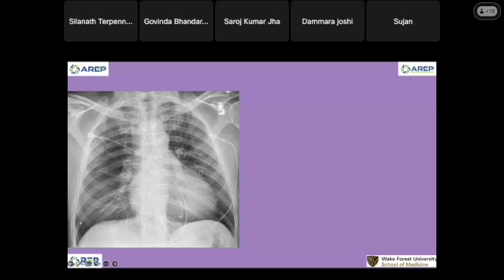Okay, that's for now. If we see this study on your end here, I'm gonna say cardiomegaly. When I say cardiomegaly, I say enlarged cardiac shadow or cardiac silhouette. I don't say cardiomegaly because for me, the words enlarged cardiac silhouette can be one, really, really big dilated chambers, or two, something else like an effusion. So it means both. I normally say enlarged cardiac silhouette. People say a lot, cardiomegaly. They use it interchangeably, but for me, it's just for me. It's your preference, but the clinician understands. And if we are really highly concerned for pericardial effusion, we add something after that.